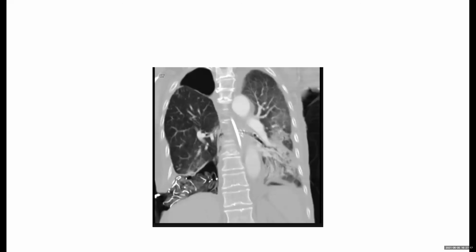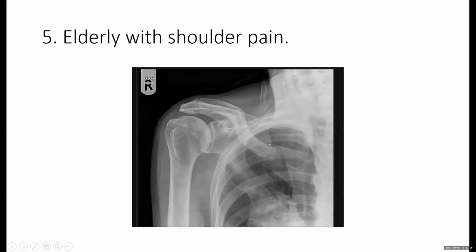What is the procedure name? It's a Clagett's thoracoplasty. I'll tell you the spelling later, maybe. Okay. Do I have time for one more case? Okay, it's the last one.